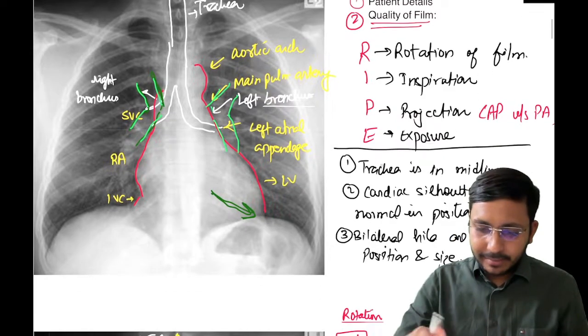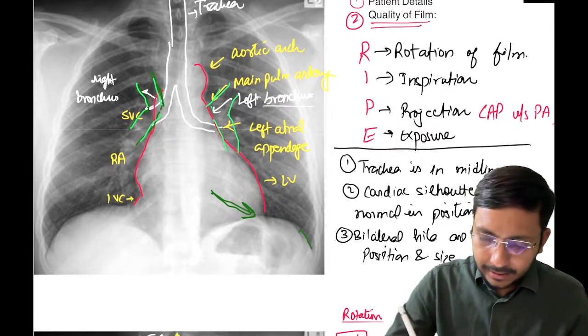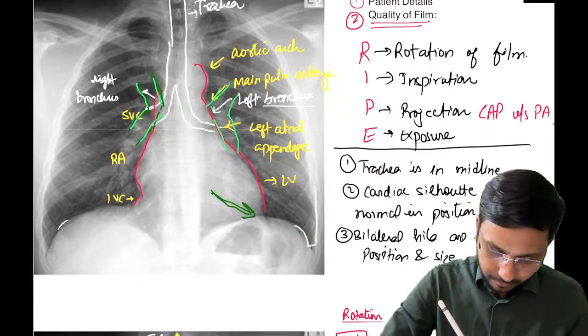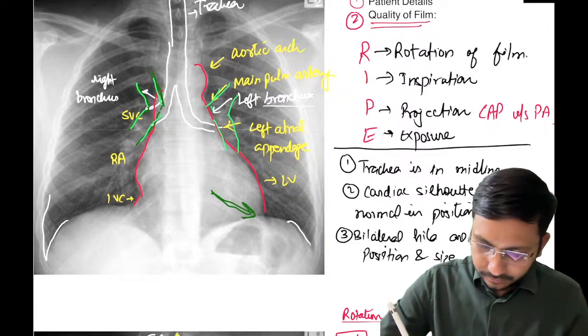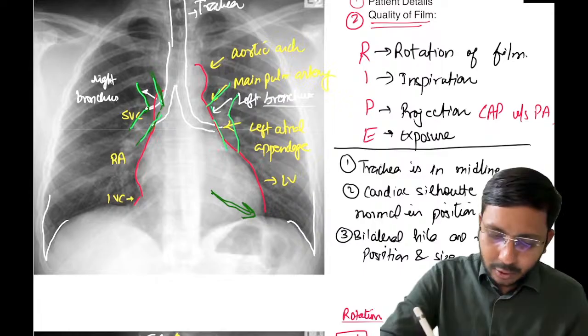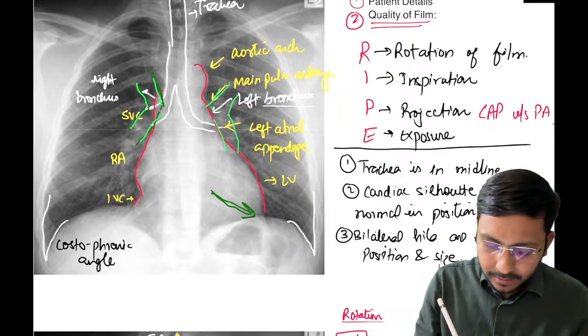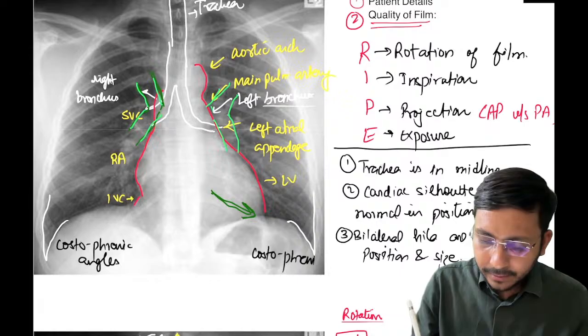Now from this we move on to cardiophrenic angle, sorry, costophrenic angle. These angles are known as costophrenic angles.